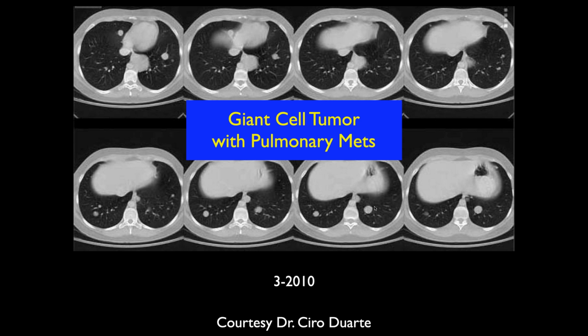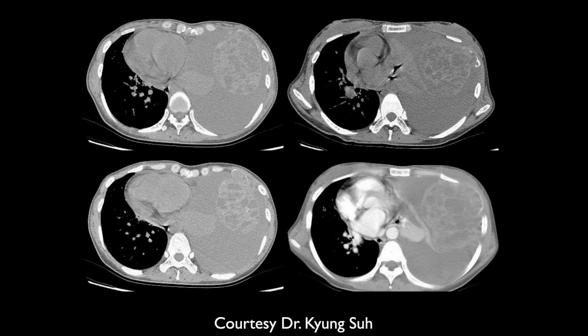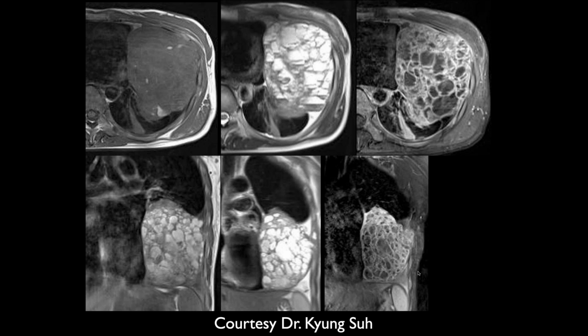Okay, Michael. Normal or abnormal? Abnormal. There's complete whiteout of the left hemithorax with displacement of the mediastinal structures to the right. At this point, you don't know what it is. On CT imaging, we see this large heterogeneous mass with low density stippled throughout. I don't know if it's fluid signal. Then there's complete collapse of the left lower lobe and a large pleural effusion.